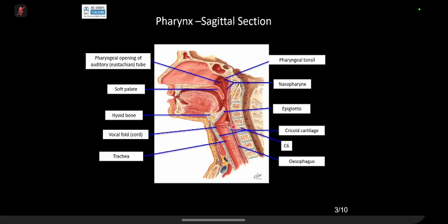Now, this region, technically, the books tell you that the esophagus starts at the C6 level. This is what a book will tell you. So this is C1, C2, C3, C4, C5, C6. This is C6. But anatomically speaking, to differentiate between the hypopharynx and the larynx is not possible. And it all depends if a patient has, for example, taken a deep breath in, everything goes down. So we don't bother about it.